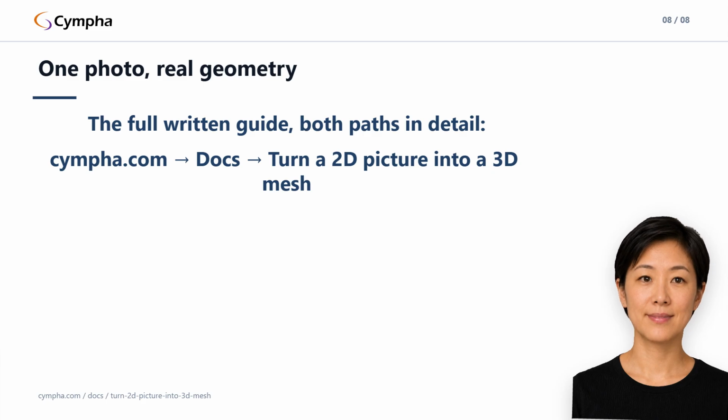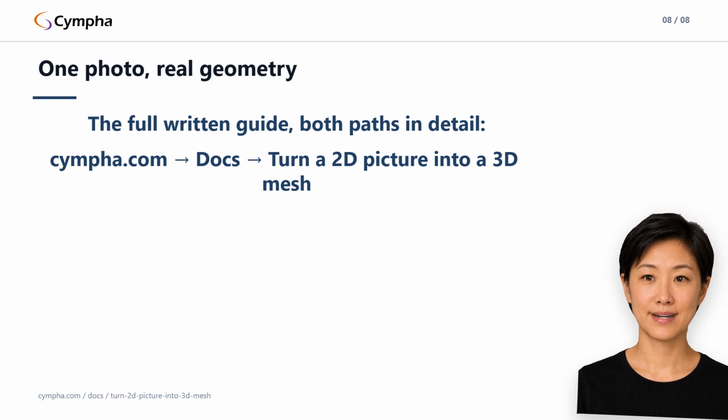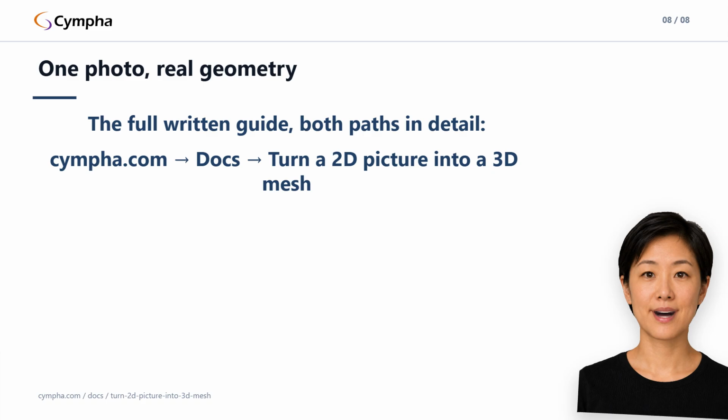That's the feature: one portrait photo in, a face mesh out, standalone in seconds, or bone registered with two extra panels when the CBCT is loaded first. Load the volume before you start when alignment matters, reach for nose depth only on the photo-only path, and let the result live in the scene like any other model. It's one of the quickest wins in Studio for patient communication. A mesh the patient recognizes as themselves changes the conversation in a way a generic model never does.